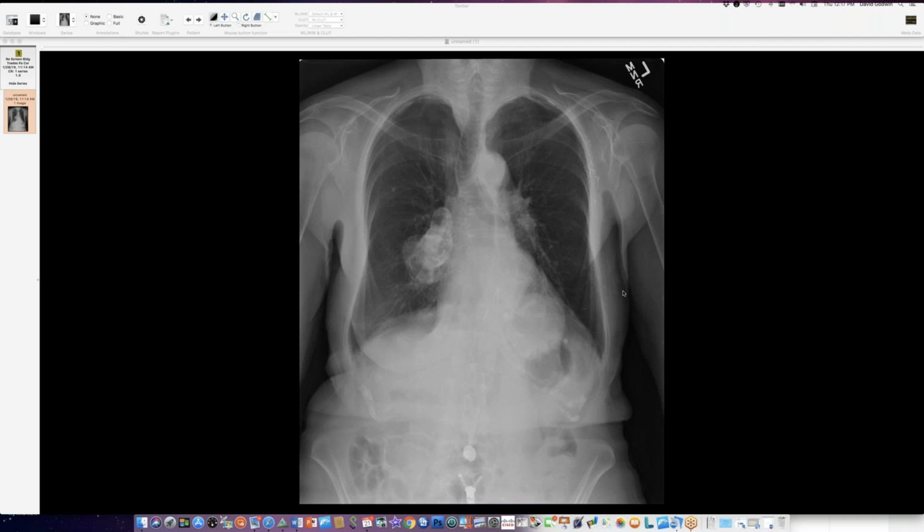So can people see a chest radiograph here on a woman who's had breast cancer surgery? Yes. You sent for a B reading, and she's from Kentucky, and she's got these massive, rim calcified lymph nodes here in the right hilum, and at least one calcified granuloma down here in her left base. And I don't have any more imaging than this. I don't have a lateral view, and I don't have a CT scan, because I'm sure that we would see calcifications in her spleen.